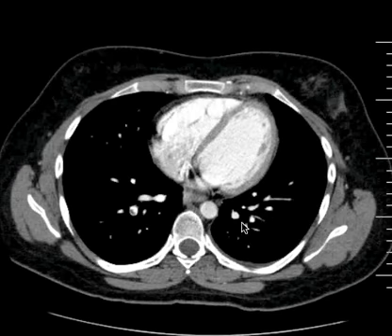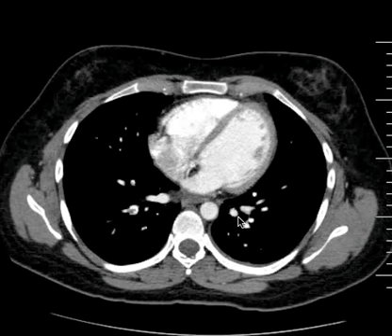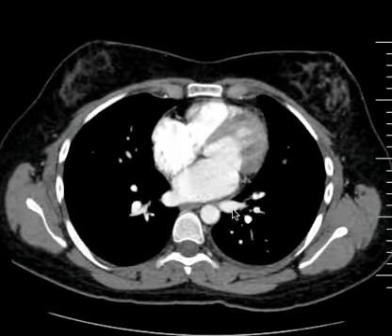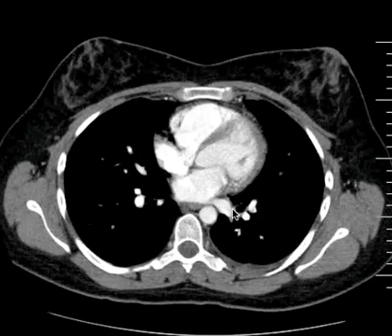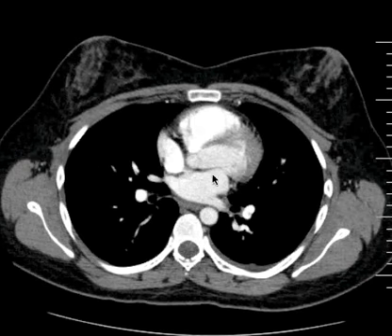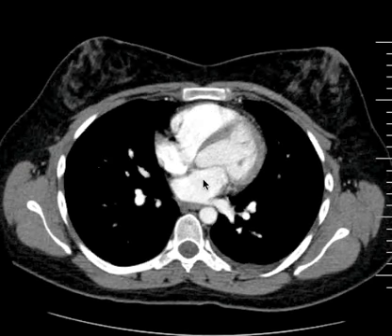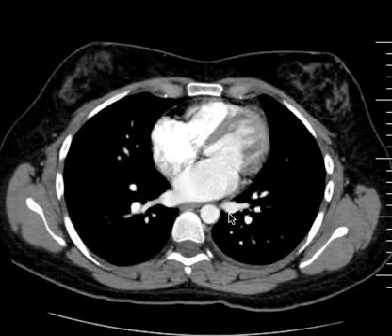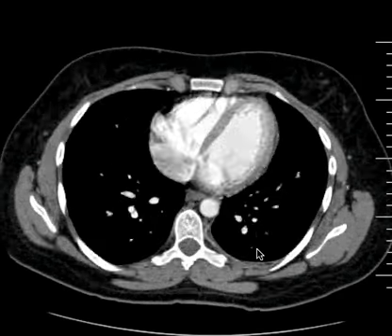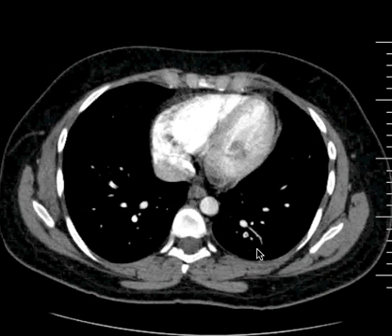Watch where it goes. Okay, here it is here still. Watch it closely. It's joining another vessel. It's joining another vessel. Where is it going to go? It's going into here. And what is that? It's going up into the left atrium. The left atrium. And here you can see the mitral valve. And so this is a pulmonary vein. So that was a demonstration of the distinguishing feature of a pulmonary vein and pulmonary artery.